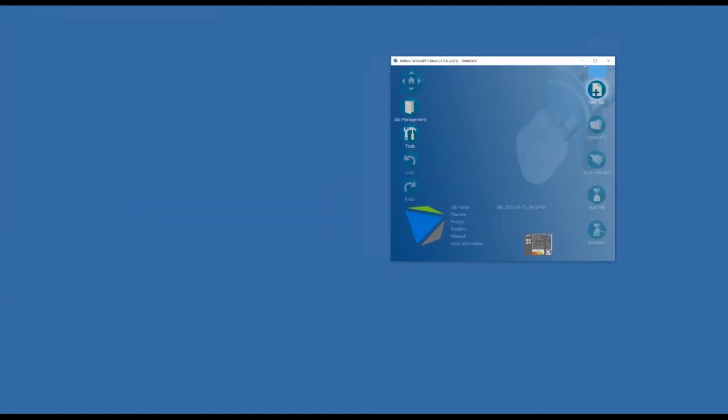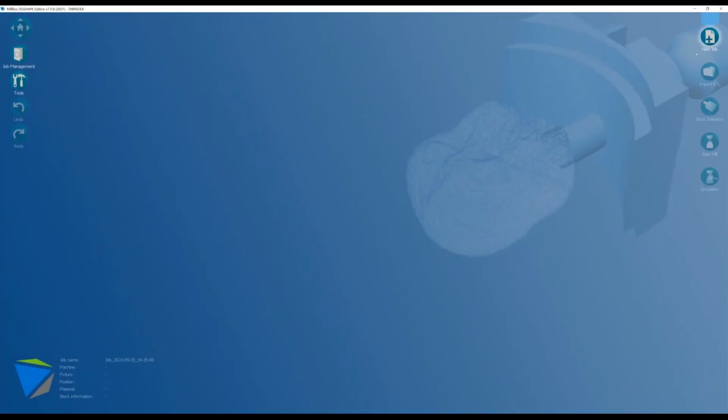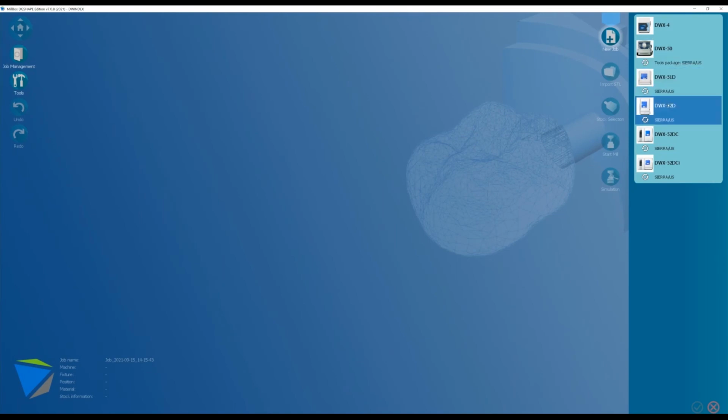Looks like I need to reopen it. Wait for it to open back up here. Again, we'll do questions at the end, so I hope I'm kind of generating some questions. I'm sure you guys using the software every day are going to come up with some good ones for me. So let's go back to the new job and let me ultimately show you this intelligent stock selection.